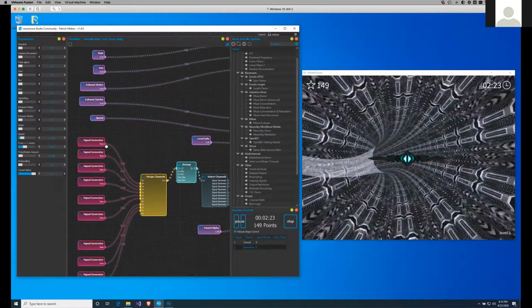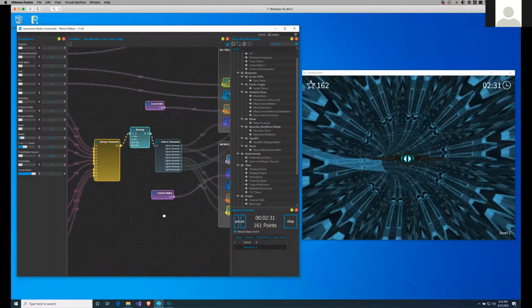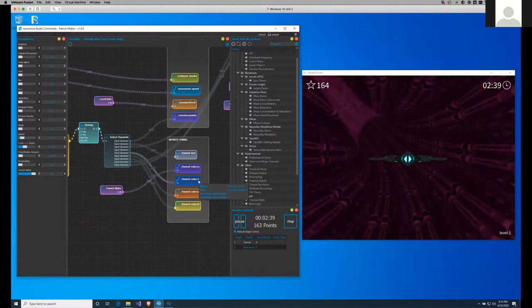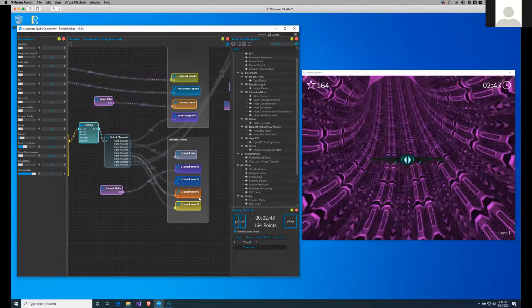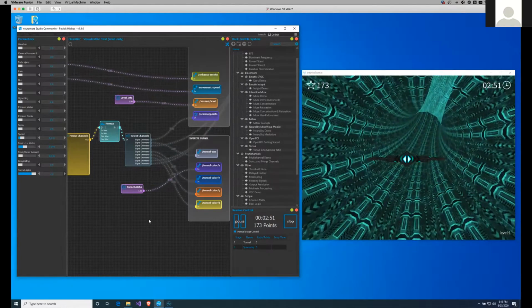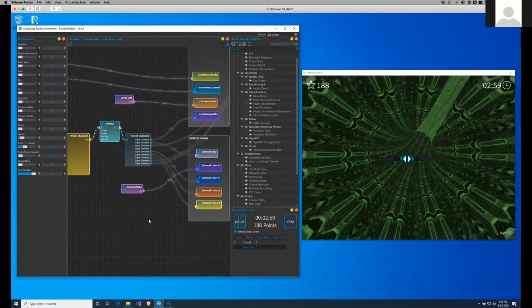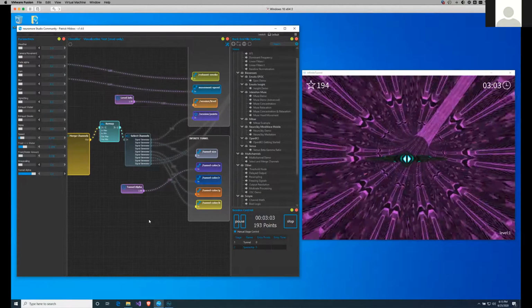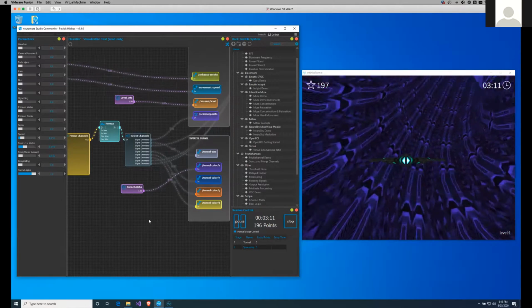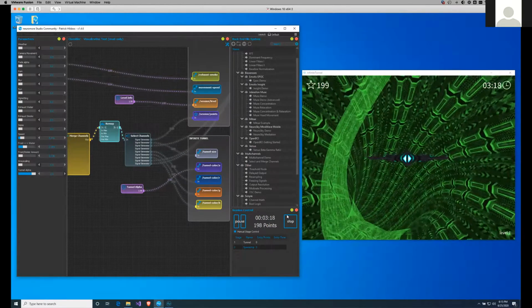What you see in the tunnel is its color changing, and that happens here. It's not a parameter currently, it's just a signal generator. And you see that the infinite tunnel has tunnel color A, which is the tunnel alpha that's mapped to the parameter, and then there's a red, a green, and a blue channel that's being fed into the tunnel. Using that signal generator, the tunnel changes its color automatically. But of course, you could also map the color to a particular parameter. And you can also map that particular feedback node to any kind of real-time biofeedback data, result of a calculation, and so on. But like already mentioned, we will do that shortly.